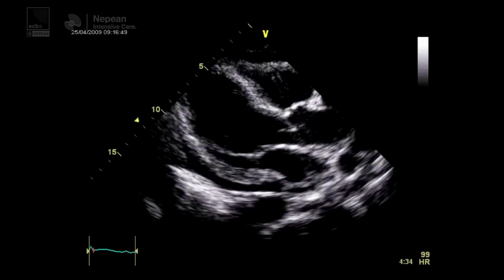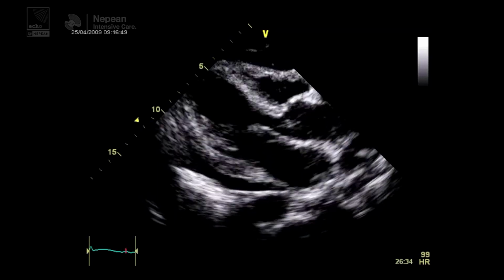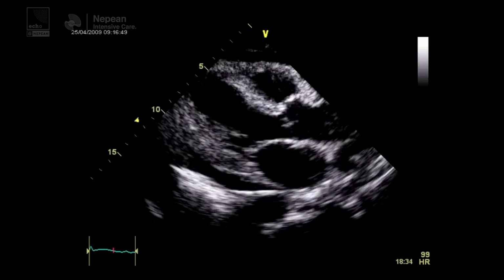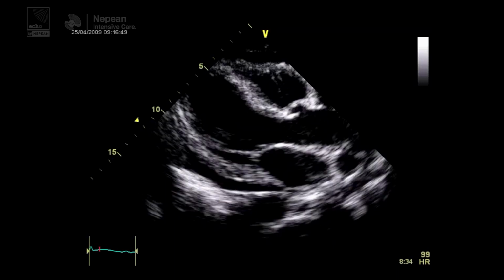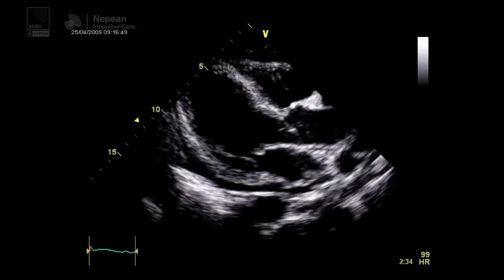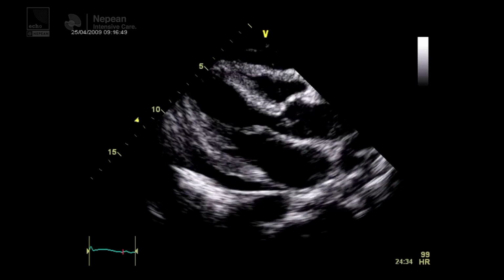Often blood looks similar to the speckling of the myocardium, and it can be really easy to mix those two up. And then with infection, it could be pus in there, or exudative collections. Sometimes you can see fibrin strands, and it can look quite nasty if you've got someone with a purulent pericardial collection, which we've had recently, haven't we?